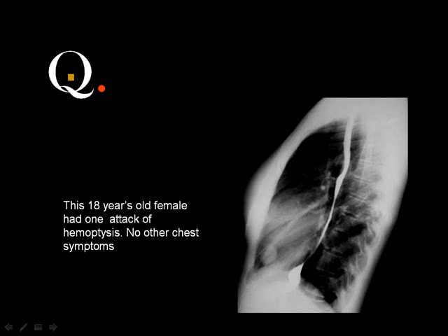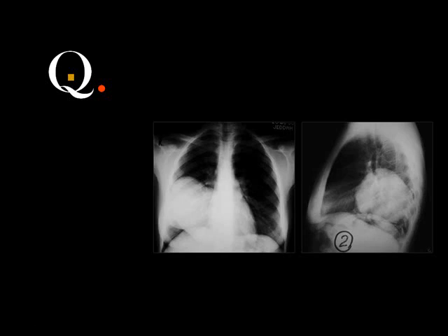Then, are you dealing with nodule, mass, patch, cavity? Nodule. What do you think about? AVM. Why AVM? Because the nodule is connected to the hilum by a vascular pedicle. This vascular pedicle may be double or single. It does not differ. Okay? Then, what do you think?